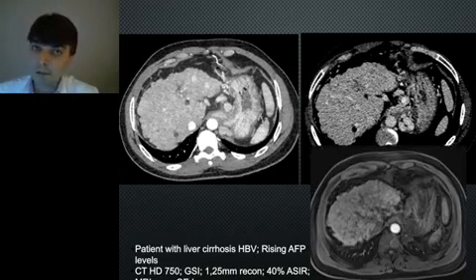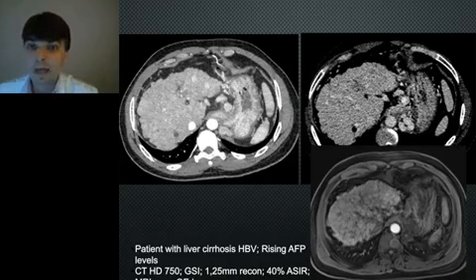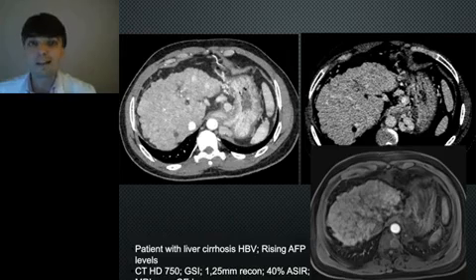We probably would have characterized those nodules as LI-RADS 4 because of the restriction of diffusion, but there's no way we could have demonstrated that those lesions did enhance on arterial phase. Again, this is only one example, and in a large cohort of patients, we do not see more nodules using spectral imaging. But we have a workflow with user-friendliness, we can see the nodules more easily, and in some situations, it's even easier than on MR to detect those hyper-enhancing nodules.